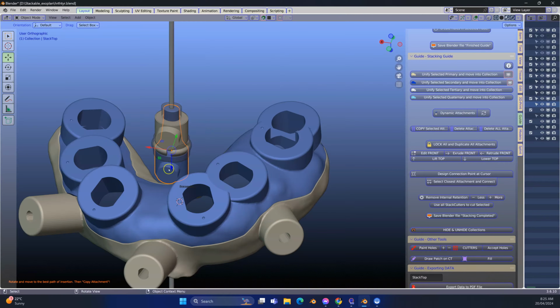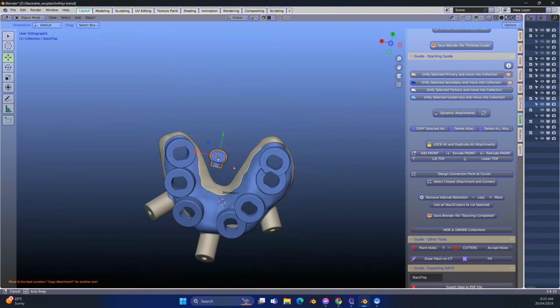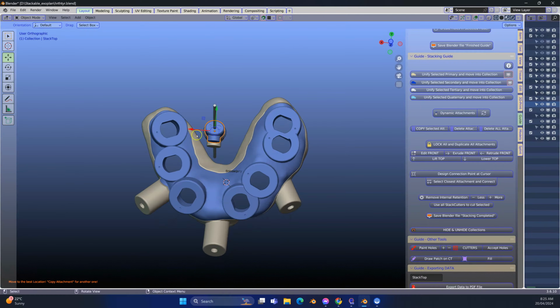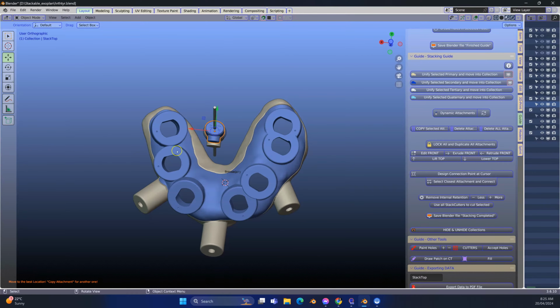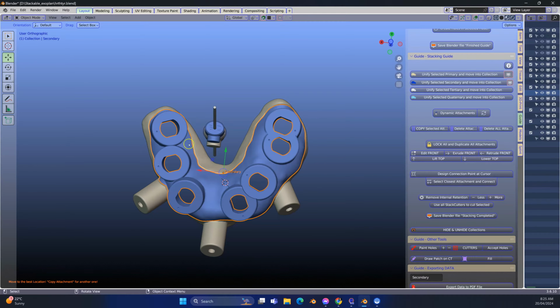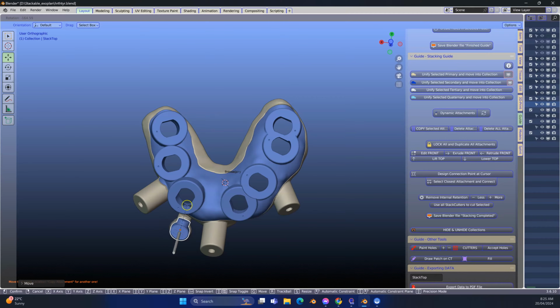Now you've got to select the top of it, and we're going to rotate it. Then look at it from the top, and we're going to now think of this as a lid which you want to put on and off of this one. So if I hide it and unhide it, Alt H, we're going to now make sure that we can clip it. Using the G key, we're going to manipulate it, and the R key to rotate it.